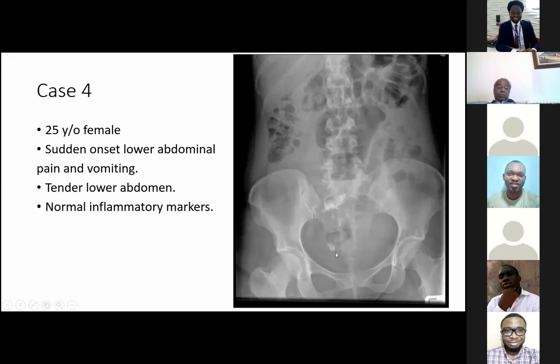Yeah, my network has been having a problem. But if this were to be a woman, then there's the possibility it's a calcified myoma, and also I can see that on the right and on the left side, the ascending colon seems to have fecal stippling, and the descending colon as well. And on the central part of the abdomen, there seems to be a dilated structure there.